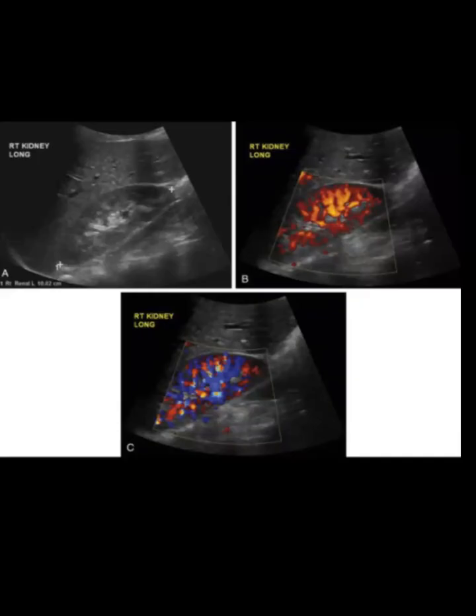You should never just say that it is a normal kidney. You should comment on the size, the echogenicity, the corticomedullary differentiation, the visible collecting system, any focal lesion and stones, and also comment on the bladder whenever possible. Sometimes in an exam, they give you a probe and tell you to scan the kidney and whether you can do the biopsy or not. Coming to the next slide.